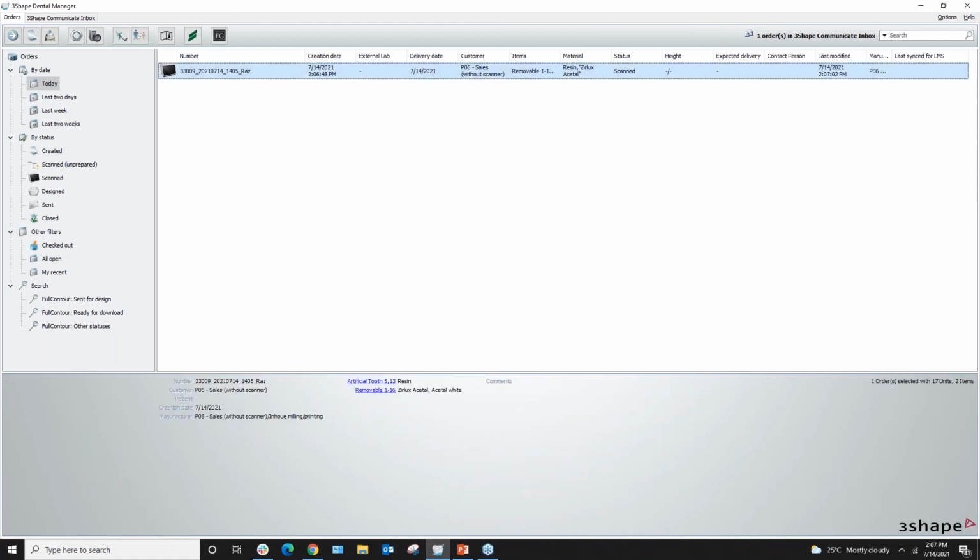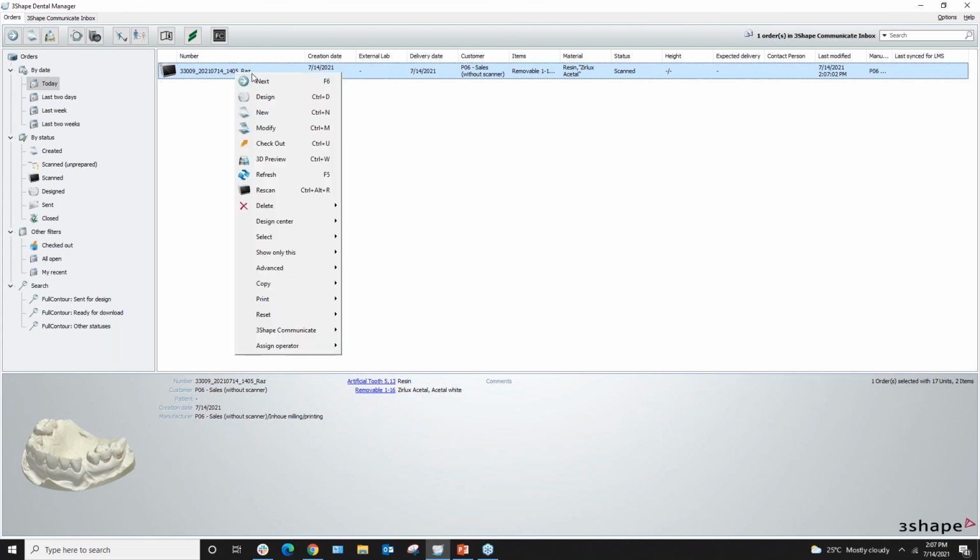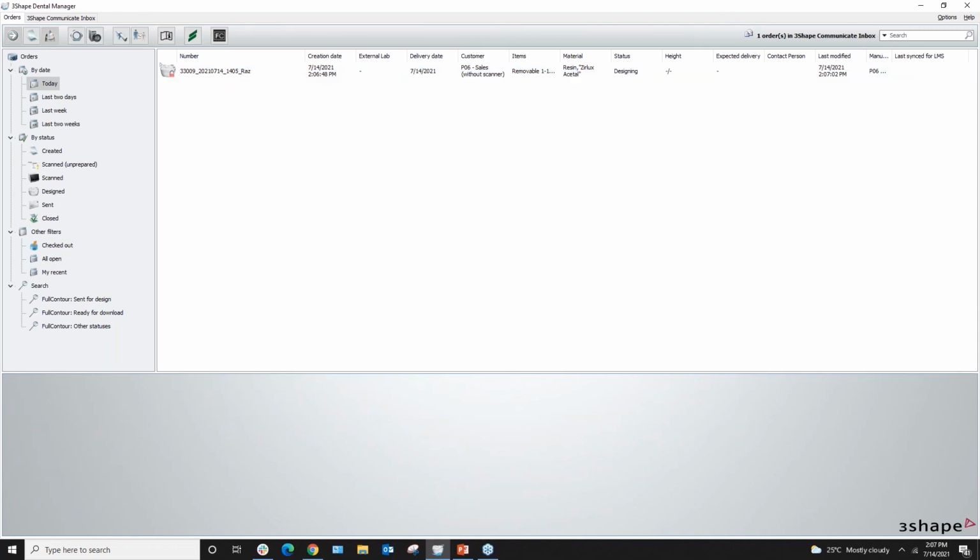Now, some of you will probably ask the question, well, why can't I use the denture module? The reason for this particular presentation is to show you how to maximize the features of an RPD module to your advantage and have a glorified immediate denture within a couple of hours of when the patient presents himself or herself. So right click away, we can move straight to the design.